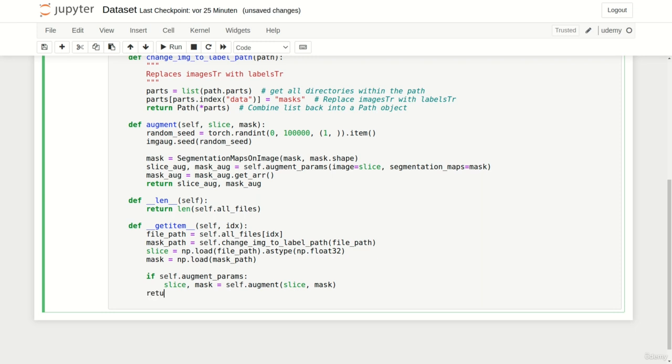Let us directly use numpy.expand_dims to add the channel dimension. It accepts at first an array and next the dimension or channel we want to add, 0 in our case. This spares us from calling unsqueeze all the time. We perform the same operation for the segmentation mask. Nice! Our dataset class is complete.